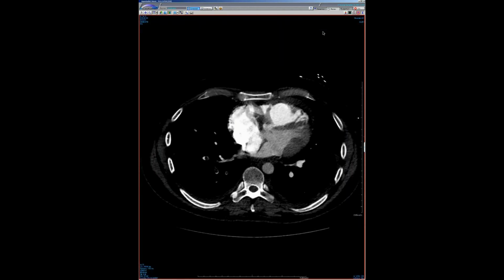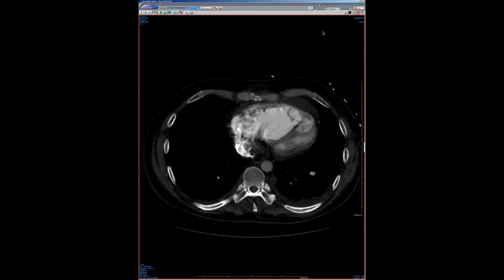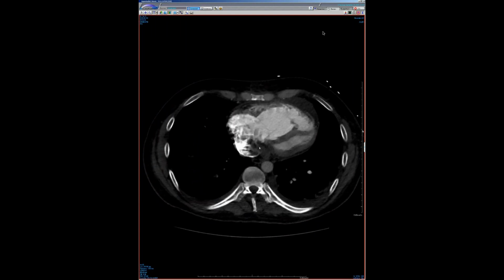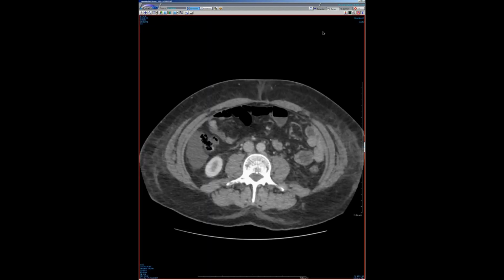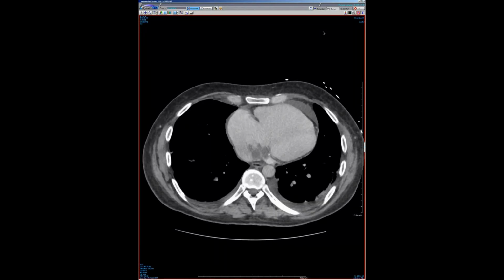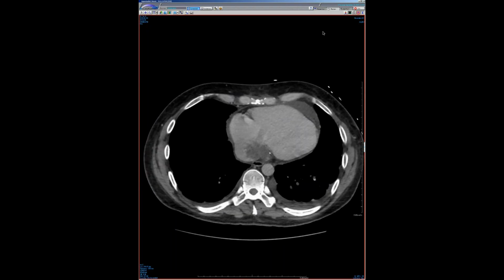But what's interesting, he has what I thought, I wasn't sure if this was some form of thickening of the tricuspid valve, but if you see here, he's got this lesion here, and you say, well, is that myxoma or is it just a clot? He had a cardiac MRI study. So here's his MRI study, and I think clearly on it, you can see that this is not just a simple clot.